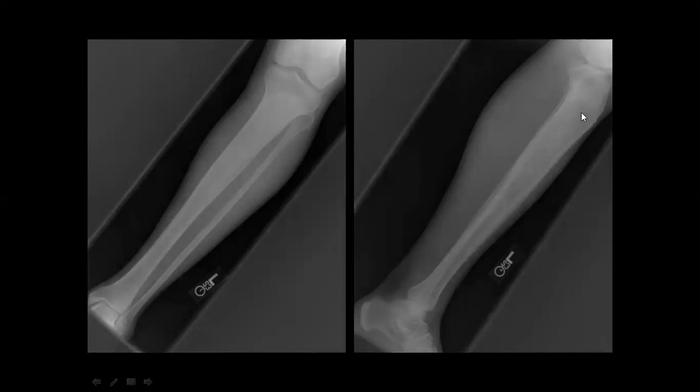So with this endosteal scalloping and this expansion, the most important thing to describe when you are in a long lesion is whether it is a short zone of transition or a long zone of transition, right? So do you agree with short zone of transition, where you can clearly know normal from abnormal, or is it a wide zone of transition where you cannot? Which one is more? Okay.